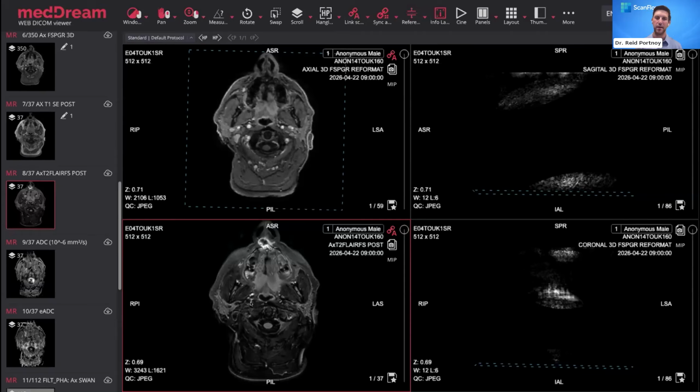So now I know you must be thinking, oh my God, he just keeps manually organizing every time. Like, I get the point. Well, I just did this 3 times. Imagine a radiologist having to do this 50 times a day. And this is the burden that radiologists are dealing with on a day-to-day basis. And this is what pushed us to create ScanFlow, to make radiologists more efficient.